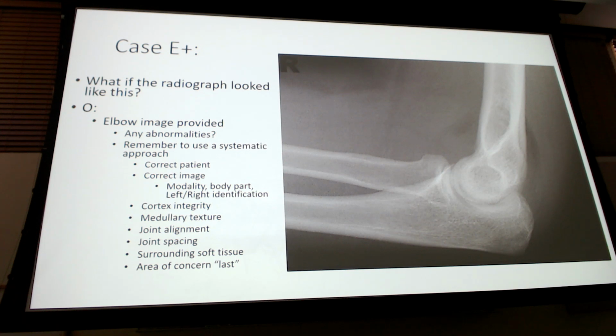Right? This is not a normal X-ray. There is a fracture in there. We can assume it's most likely in the radial head. That's where the majority of these occult fractures are hidden, is in here somewhere. Okay? In here somewhere. When we look at it, what looks like a normal X-ray but has a posterior fat pad sign.